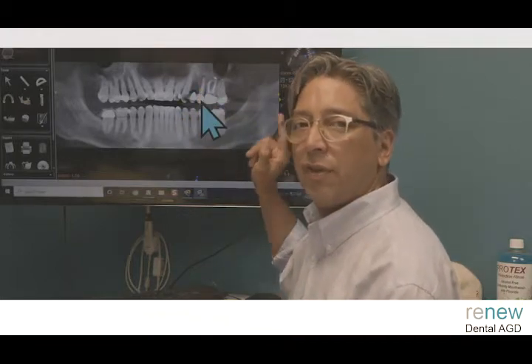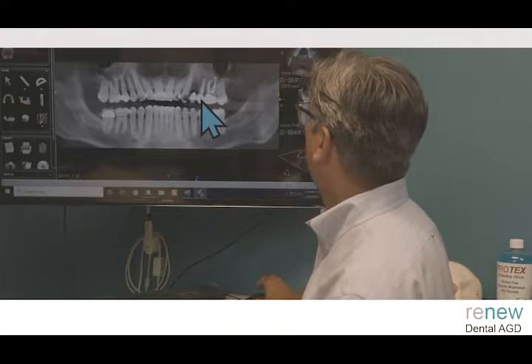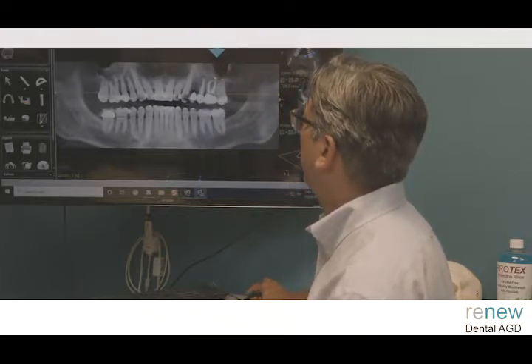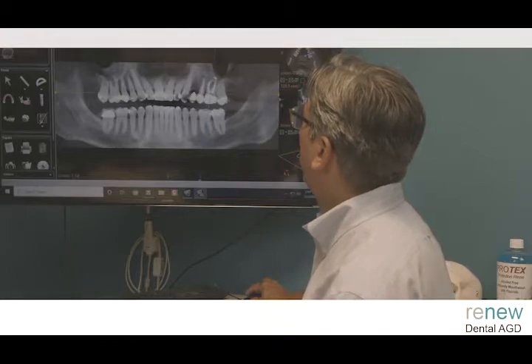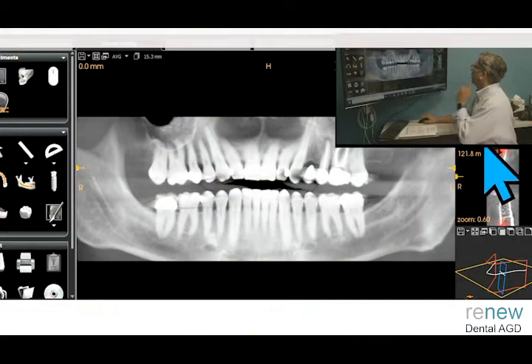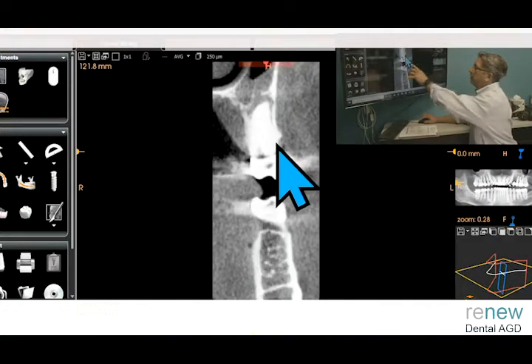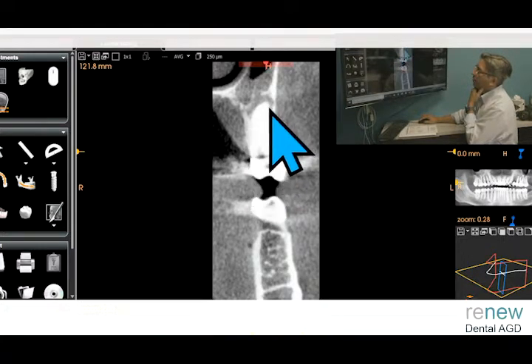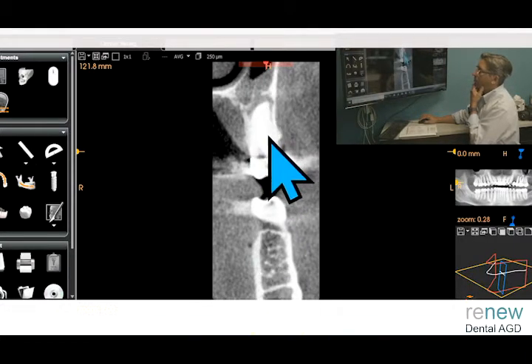So let's first look at the root canal treated tooth here and the sinus, and why this becomes more of a stepping stone into the skilled practitioner's level. And let's take a close look at that CT. If you look at this CT, she's got good facial bone and that lingual wall's okay, but here's where the infection is, and it's breaking into the maxillary sinus. Here's your nasal sinus area, here's the maxillary sinus area, here's where that infected area is, at the base of the apical part of the root.